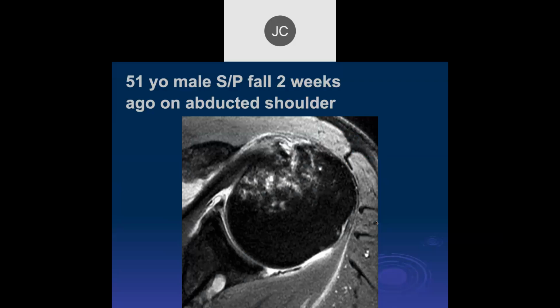Okay, let's see who's next. So, fall on an abducted shoulder.